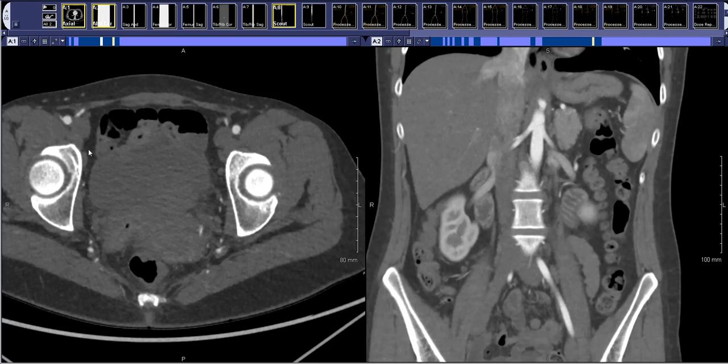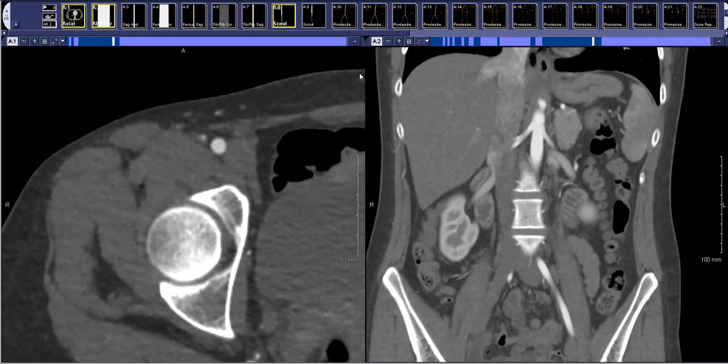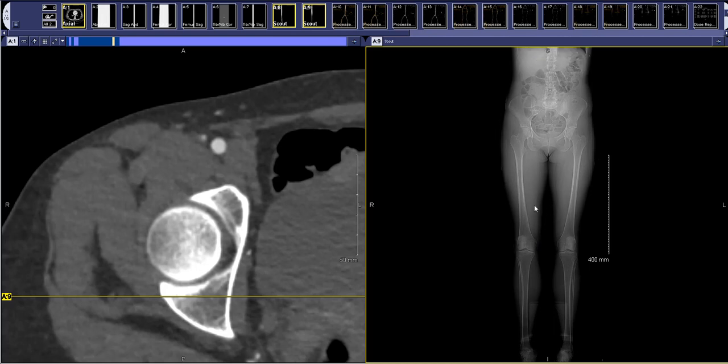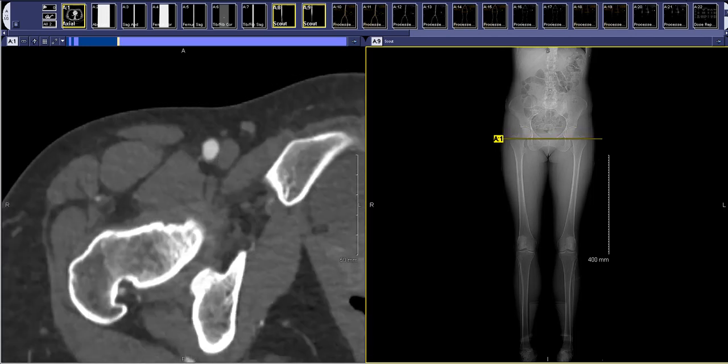So I'm going to go down the right side here, kind of zoom in and focus on the right. So as you go down the leg, it can oftentimes be hard to remember where you're at. So by convention, if you're talking about stenoses, pseudoaneurysms, or traumatic injury, many people will bring up the scout radiograph so that you can easily tell where you're at. So let's say, for example, I was following the femoral artery down to where it bifurcates.